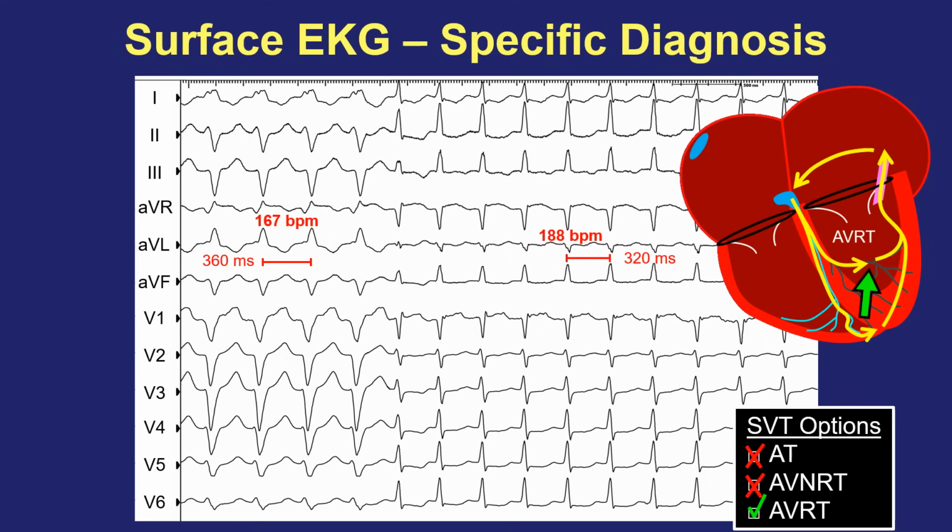So looking at the cycle length alone is not sufficient to see if a bundle branch block impacts the tachycardia, but you would see a change in the VA time, the beginning of the QRS to the earliest atrial activity. If you do see a cycle length change, it's very helpful, but if you don't, then also look at the VA time. And of course, we're going to look at that with intracardiacs.